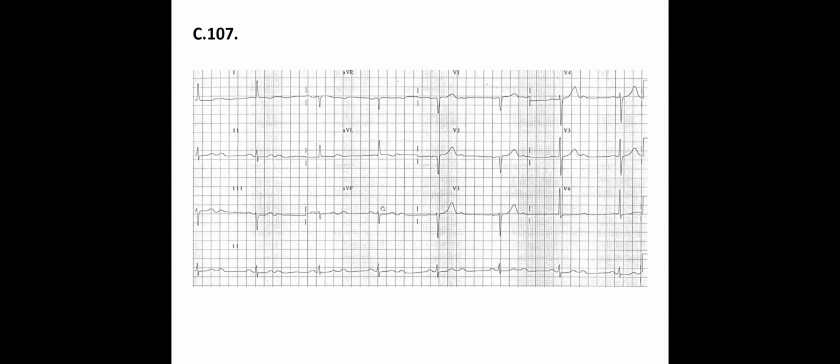Nothing. Okay. 107. This is mine. Okay, good. So when I looked at it at first, I wanted to determine if I have tachycardia or bradycardia, or is it normal, and it looked like I had bradycardia. And then I looked at the electrical axis, and it seemed okay between 0 and 90. And I determined it was 2-to-1 AV block, but I couldn't determine if it's Mobitz type 1 or 2. Exactly. So I could use your help to determine if it's type 1 or 2.